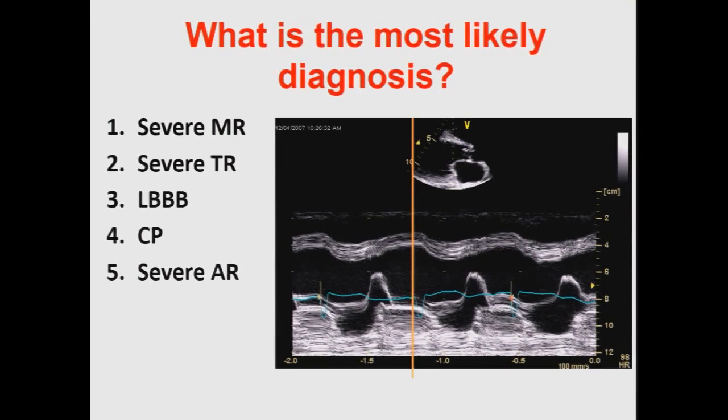Anyway, the vertical line, here we go, thank you, times out with the QRS complex, and you see that there is premature closure. Again, from the normal M-mode envelopes of the mitral valve, the second wave of mitral valve opening and closing should terminate right there, but you have nothing in here, indicating that the mitral valve has closed quite prematurely, quite before the R wave.